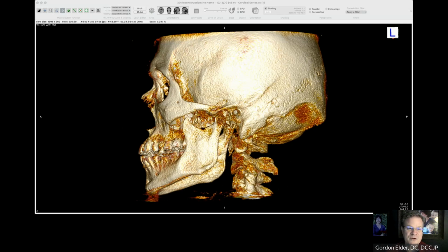So in the beginning, when you're first analyzing cone beams, there is a learning curve. It can take a while before you get comfortable with it, and you sweat a little bit. There's tutorials out there, but sometimes it just takes manipulating it like anything else to learn how to do it.